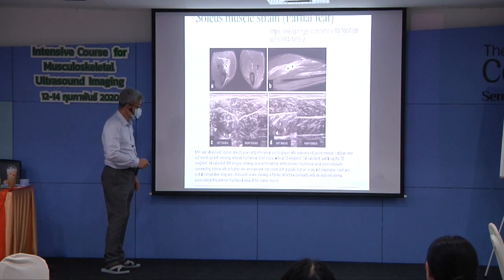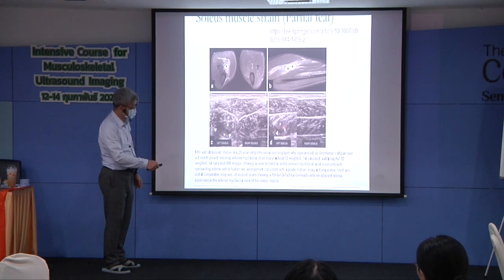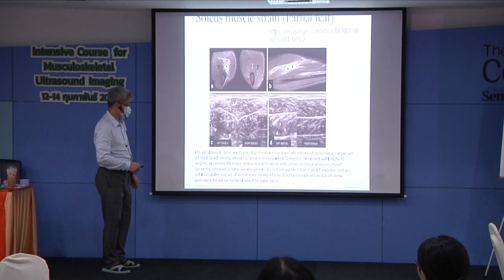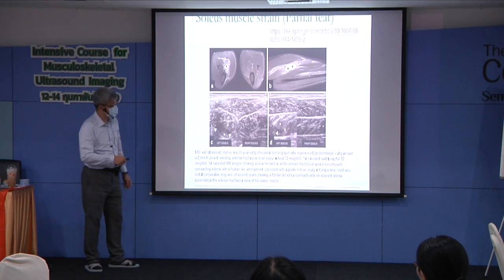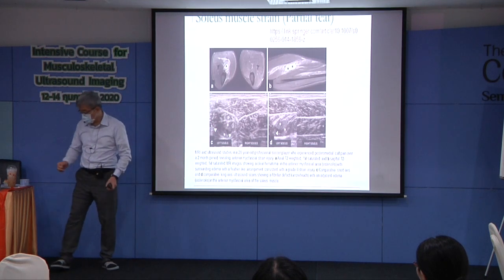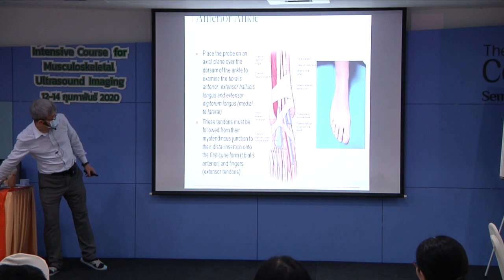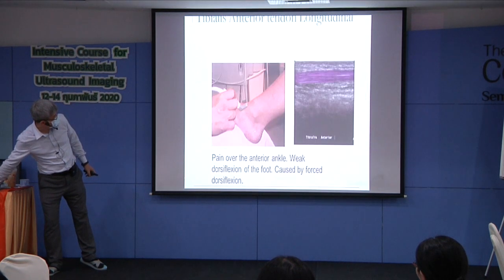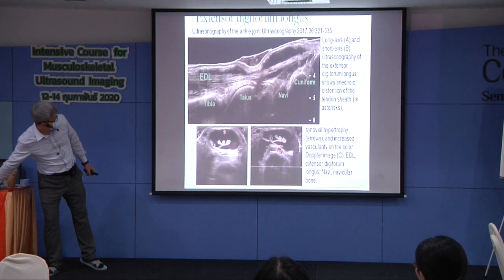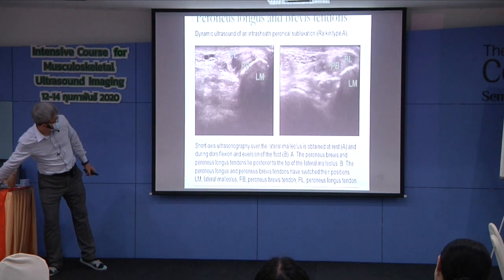Okay. This is another example. The left soleus has a muscle tear, corresponding to the longitudinal view. And MRI also proved this muscle tear observed in the ultrasound. Okay, we are going to skip this one.